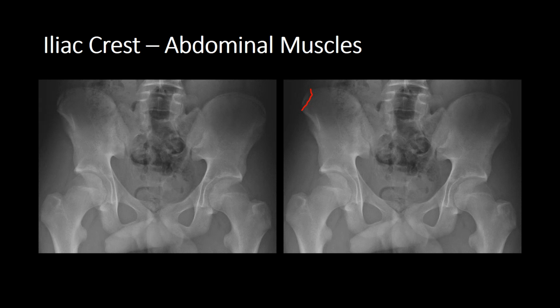If you look carefully along our iliac crest here, we can see the iliac crest apophysis on both sides, but we can see that the lateral portion of the right iliac crest has more diastasis in comparison to the left hand side, and the fracture actually extends superiorly, so it has avulsed a small piece of bone off that location. There isn't much displacement, so it's really quite subtle, and you do have to scrutinise these areas carefully in order to identify the avulsion fracture.